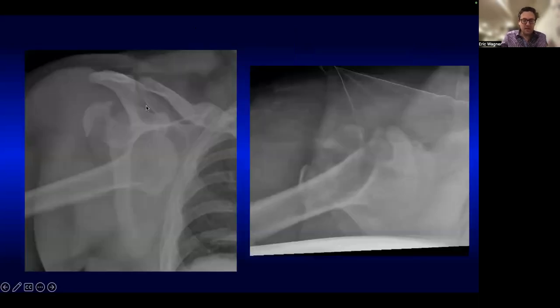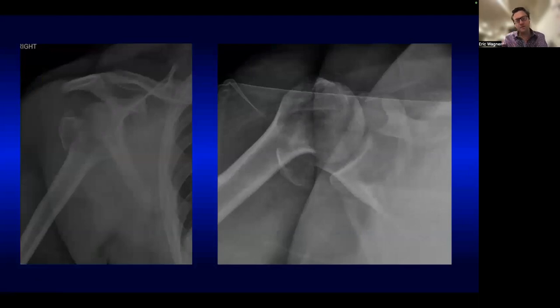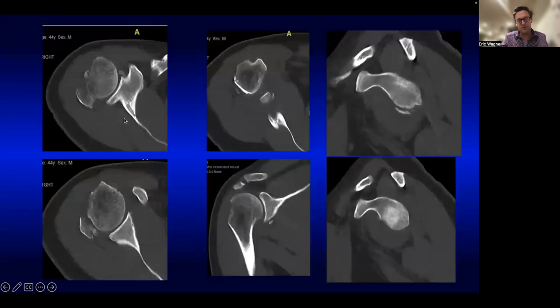This is a good one. So you can see here there's some bone left here, and it's dislocated. So this is the anterior dislocation. The tuberosity has stayed here. And then when you pop it back in, sometimes it actually reduces itself, but that's usually the sort of bad actor. You can see in this case, it didn't totally reduce itself. So here's your tuberosity still.